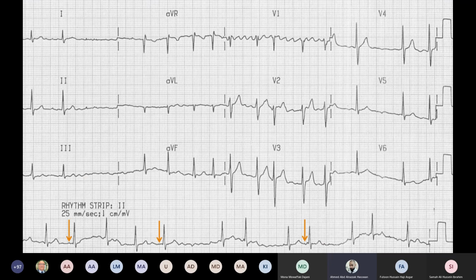Now let's compare it to this ECG. Now look at this ECG. Sometimes we have a P wave, sometimes it's a flat line, sometimes it's just an inverted wave. If you look closely, we don't have a discrete P wave, okay? It's just an abnormal line up and down. So do we have a P wave before each and every QRS complex? No.